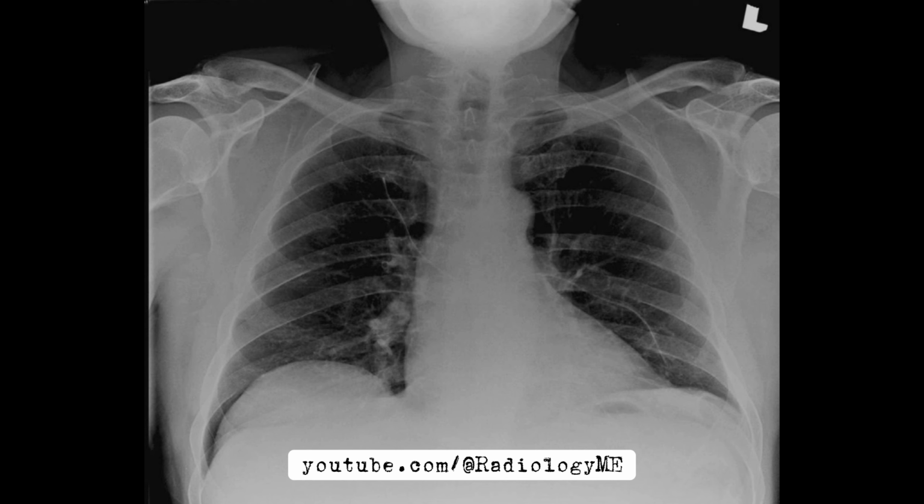We've got a chest radiograph here, and as always, I'll walk you through it step by step. First thing that jumps out is that the lungs are clear. That's a good sign in a patient like this. There's no obvious infection or consolidation, which could sometimes complicate things. But that's not what we're really focusing on here. Now let's talk about the main finding.